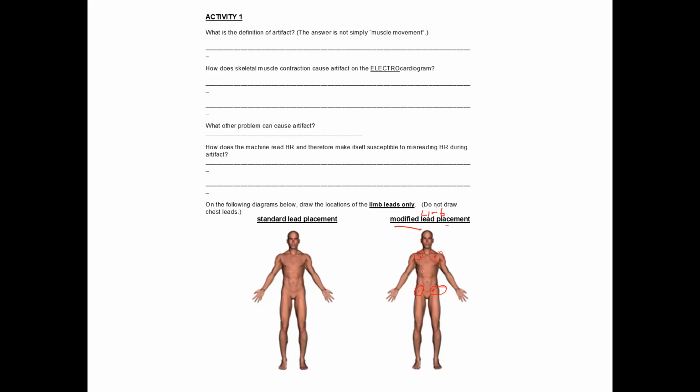Now, next week, we'll do a standard 12 lead EKG, which involves limb leads and chest leads. So the limb leads would go on the wrists: right arm is white, left arm is black. And then down at the ankle, you'd put the right green electrode, and on the left ankle, you'd put the red electrode. And then we'll show you next week how to do the chest leads.